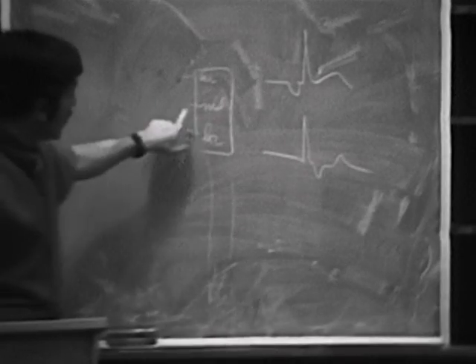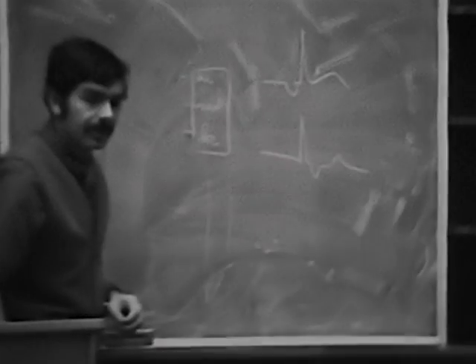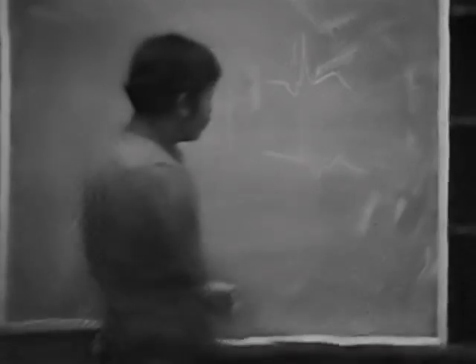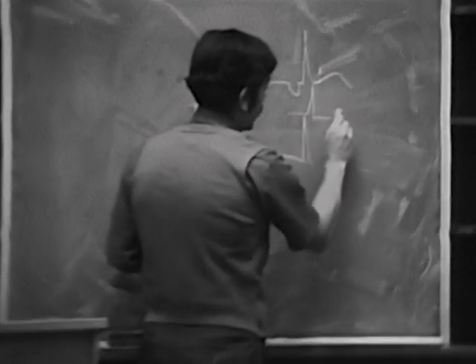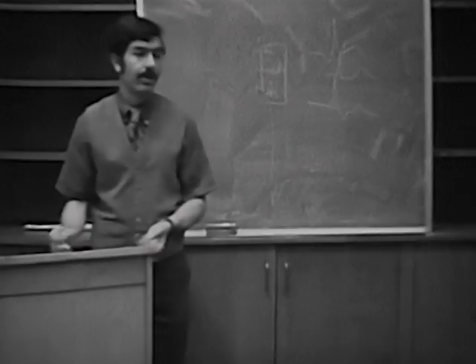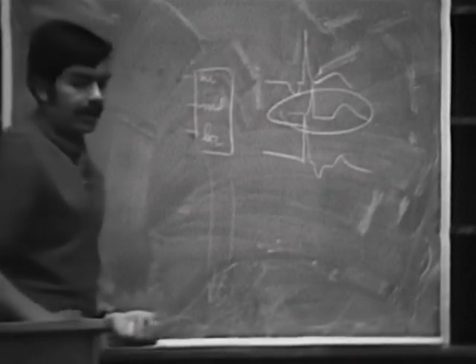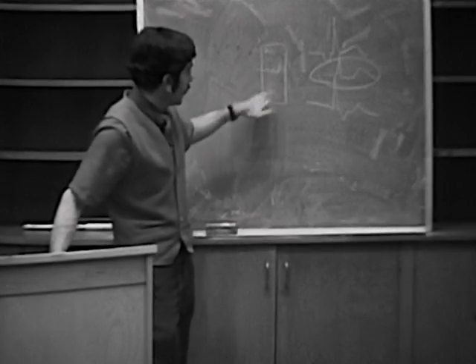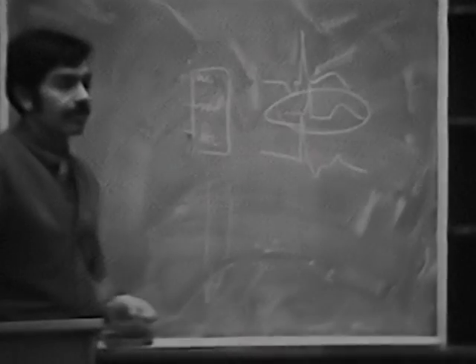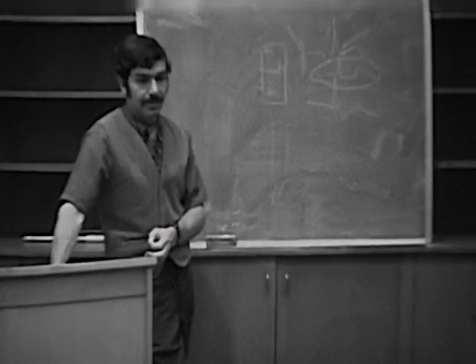Okay? And if we have a mid-nodal rhythm, what's going to happen? No P wave, right? You're going to lose your P wave. And they say that the P wave is really lost in the QRS complex. And this is the most common thing that we see. And I've read someplace, and I suspect that this probably isn't the sequence, that this isn't really what's taking place at all, just a way of thinking about it. Right? It's a nice way of thinking about high, mid, and low nodal.